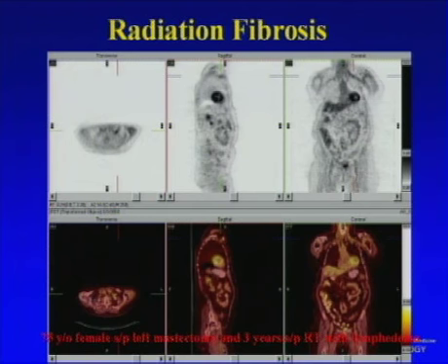This is another case that was presented at NYU. This was a 75-year-old who underwent a mastectomy and radiation therapy approximately 3 years ago, who subsequently presented with lymphedema. If we look at our PET images, we can see that there's a little nodular area of increased uptake, but again, along the course of the subclavian vessel, we see mild uptake of FDG.